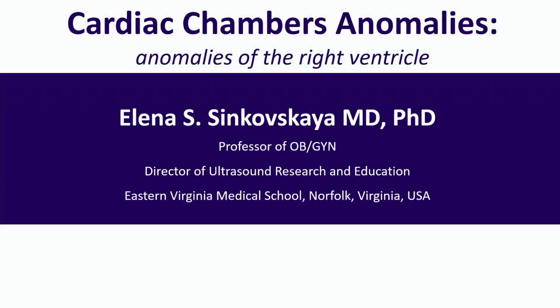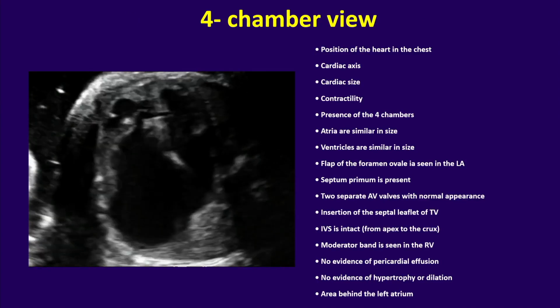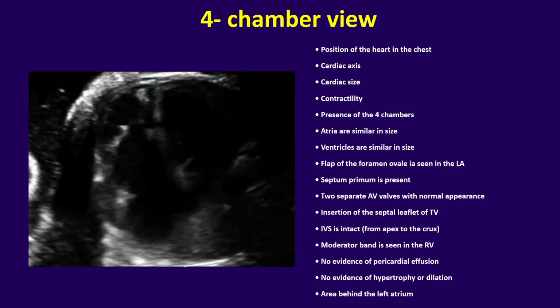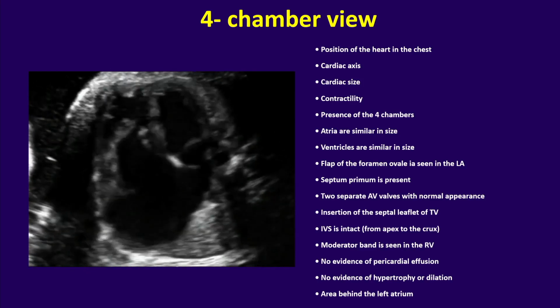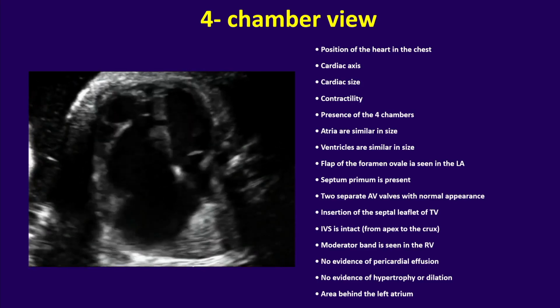And we are going to start to talk about the specific malformations that can be recognized in the four-chamber view. And as Dr. Abu Hamid really nicely highlighted in his presentation, it's very important to take a look at the four-chamber view in a systematic manner. And here we present the checklist that we're actually using on an everyday basis in our department to describe all the structures that can be seen in the four-chamber view this way.